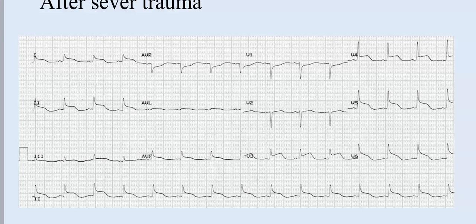Okay, it's ST segment elevation approximately everywhere, right? Like precordial and part of the inferior. Okay, no Q wave and sinus rhythm. Believe it or not, this is the effect of intracranial hematoma, intracranial insult. So intracranial insults lead to so much confusion.